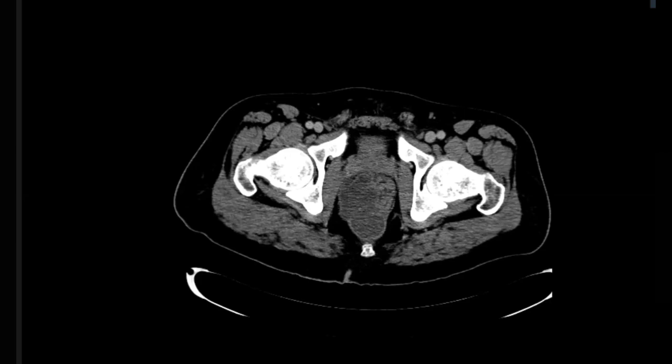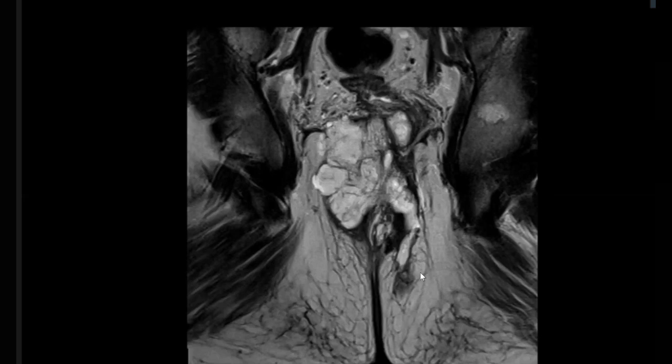So this is the MRI. MRI showing a large lesion with bright T2 signal intensity. This lesion tends to be fistulizing. From the characteristic behavior of mucinous adenocarcinoma, usually it is a fistulizing tumor. So if the patient presents late, you don't want to delay the patient for 6 weeks, 7 weeks to make sure this is an abscess or not. Usually consider a mucinous tumor, even if the patient has abscess or collection or discharge, you have to consider mucinous adenocarcinoma. This patient tends to be mucinous adenocarcinoma of the rectum, locally advanced.